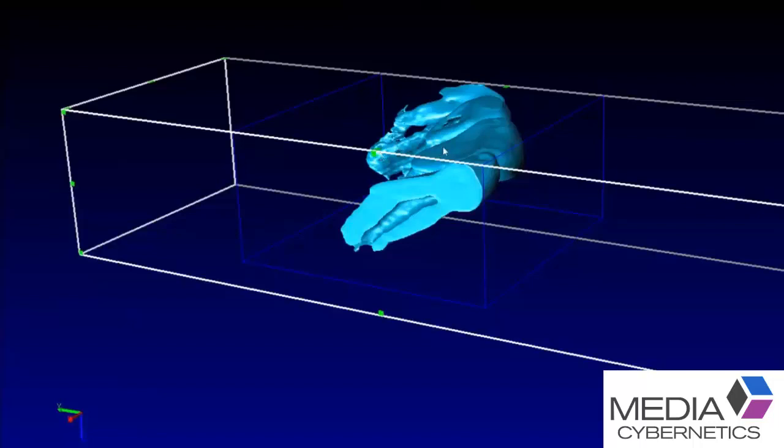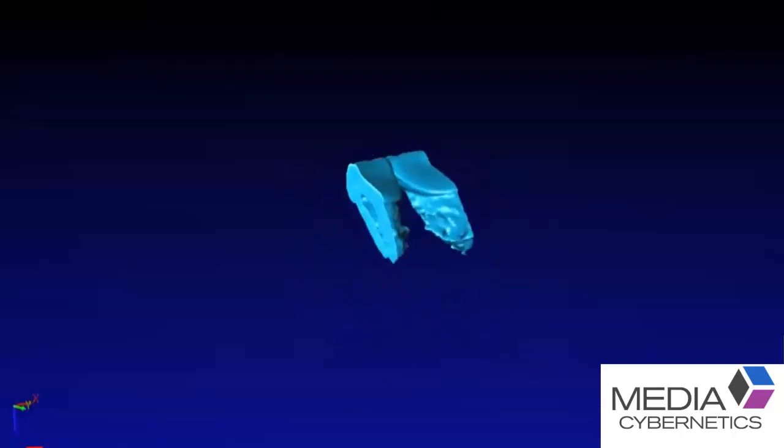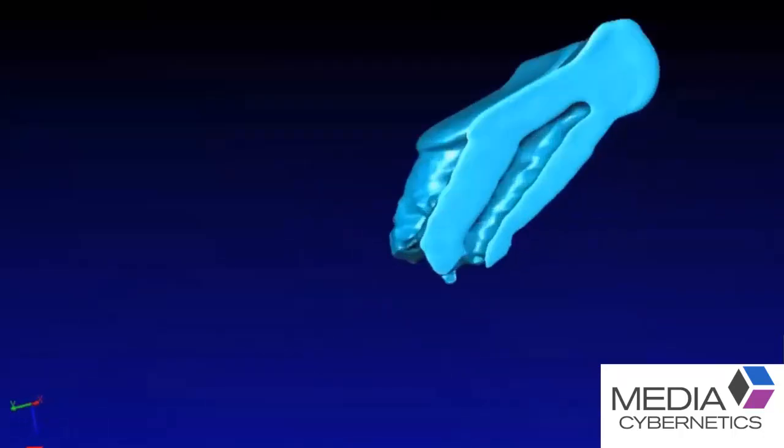When you do apply an isosurface and get a measurement, we can also do sections through that volumetric isosurface render. In this case, the tooth is sitting at an angle, and we can now see this opening in the center, and this is where the nerve would pass through, and this was a particular definition that the particular researcher was interested in. So I think this just shows a visualization of that occurring, and then we'll take some measurements here in a second.